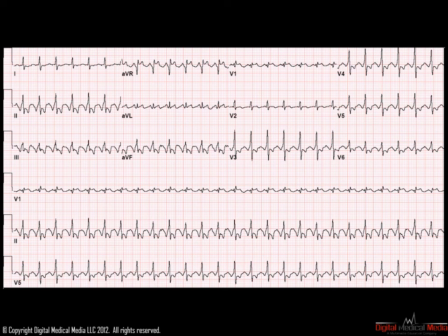That means that the ventricular rate in atrial flutter must always be some even factor of 300. In other words, the heart rate in atrial flutter will divide easily into 300 beats per minute. The choices, therefore, are 150, 100, 75, 60, 50, just like the numbers we use to count off heart rate. Therefore, once a rhythm is going at one of these very specific and fixed heart rates, we should look to see if there is atrial activity at 300 beats per minute.